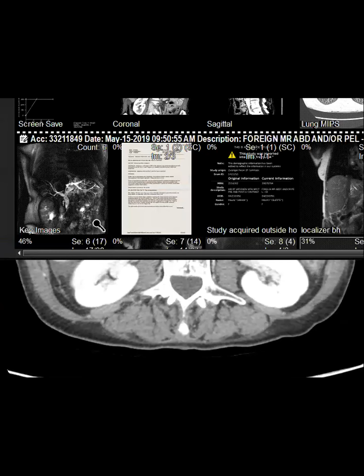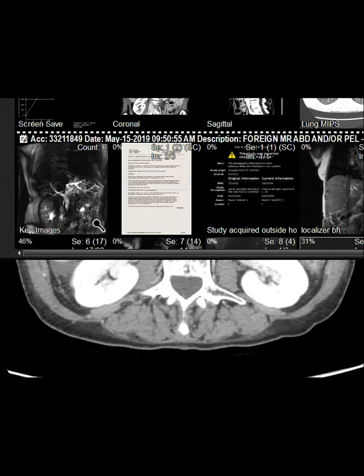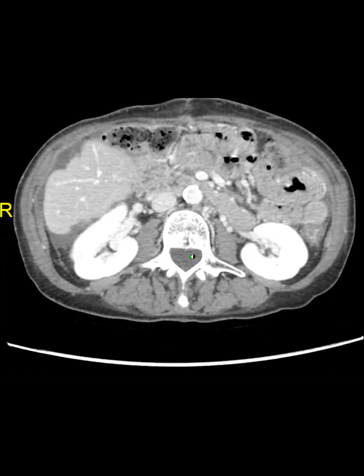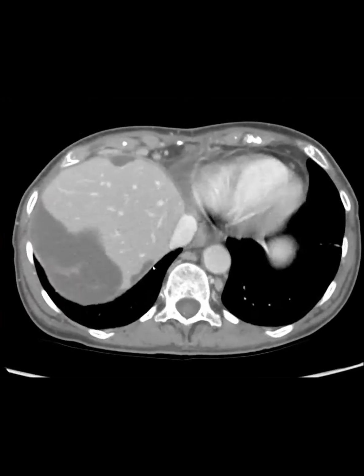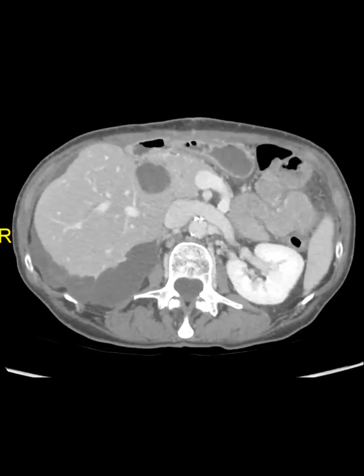I think the main thing is to differentiate, it used to be called pseudomyxoma. It's now called DPAM, but the main thing is to differentiate this sort of acellular mucin, which is the low grade mucinous stuff, versus mucinous adenocarcinoma, where you might actually see solid stuff. It's mostly in the context of appendiceal tumors, but it's kind of the analogous thing here.